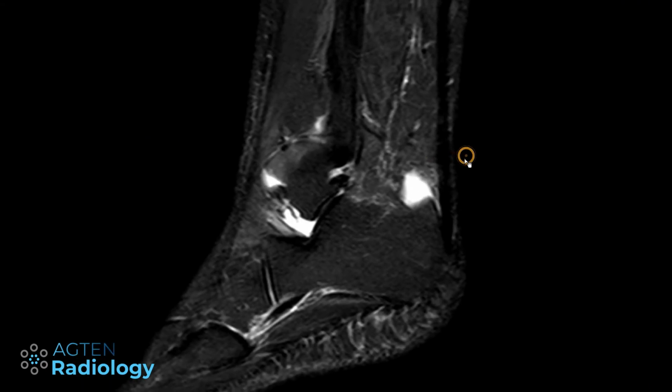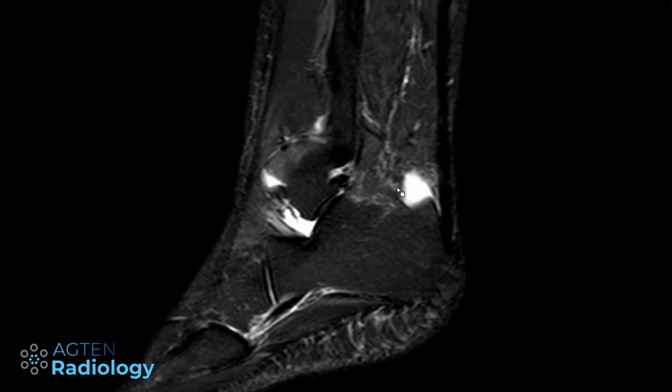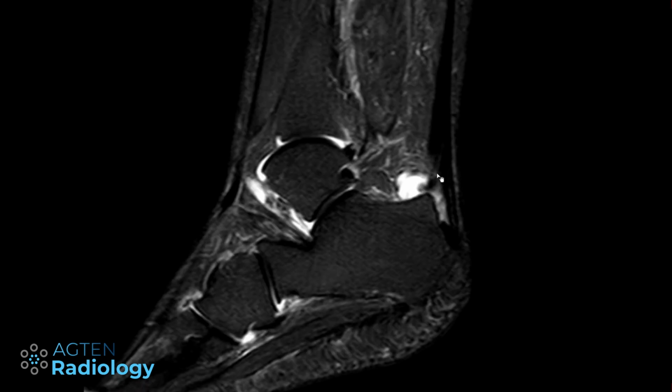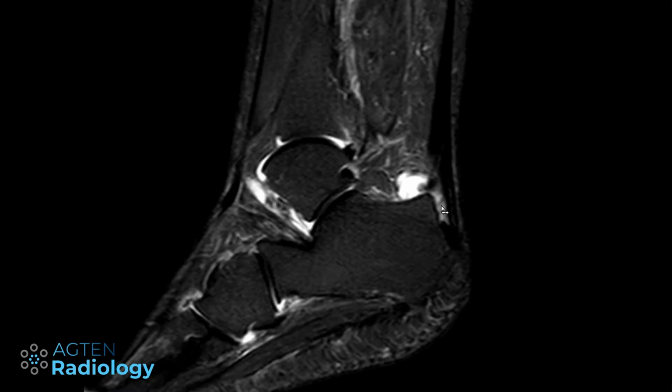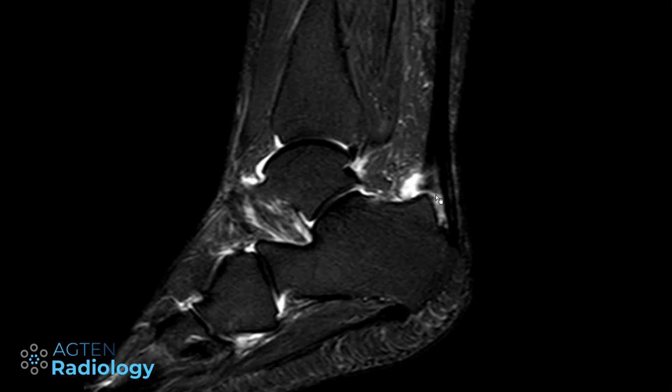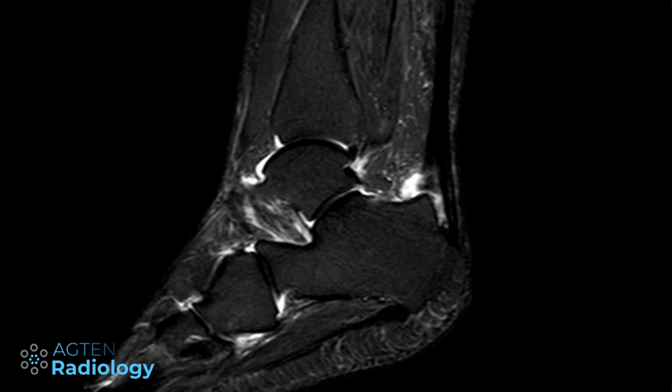This one here is another case, and again, as in the previous one, you can see the amount of fluid is way out of proportion. And in addition to the bursitis, we have a partial tear of the Achilles tendon at the level of the insertion. So now all this way down here, this is way too much. So the fibers here, the anterior ones are torn, partially torn, and the superficial ones here are still intact. And together with this tear, we have an associated bursitis. Also this one here, straightforward case.